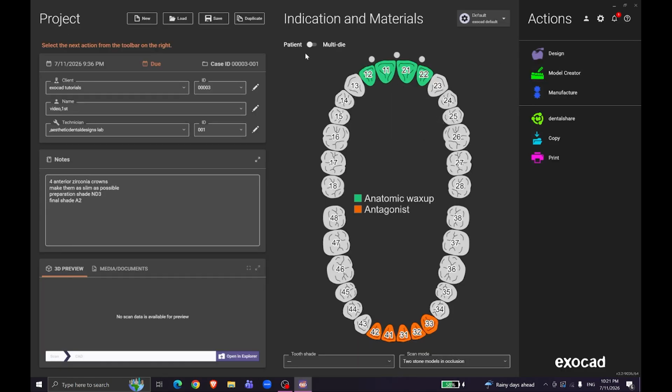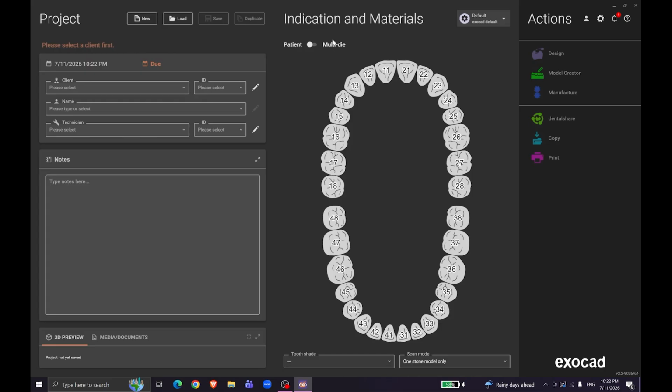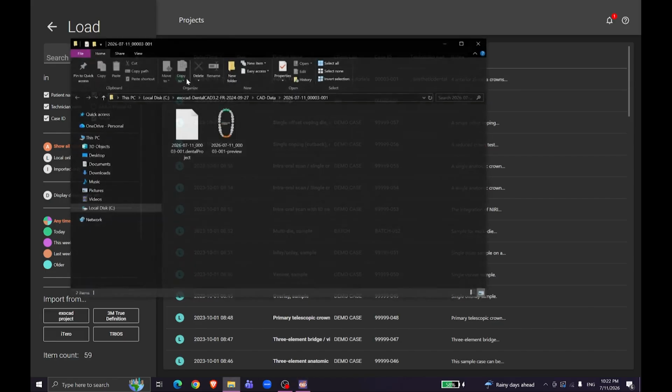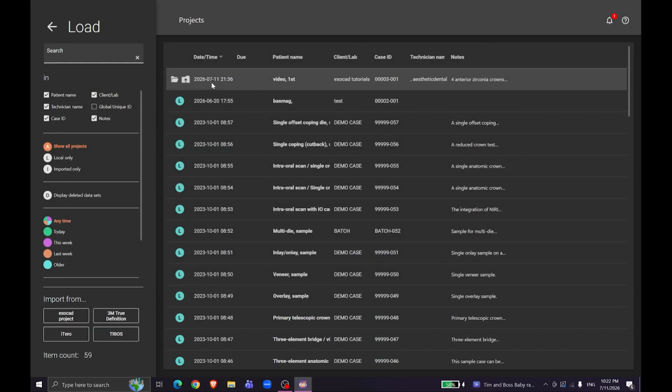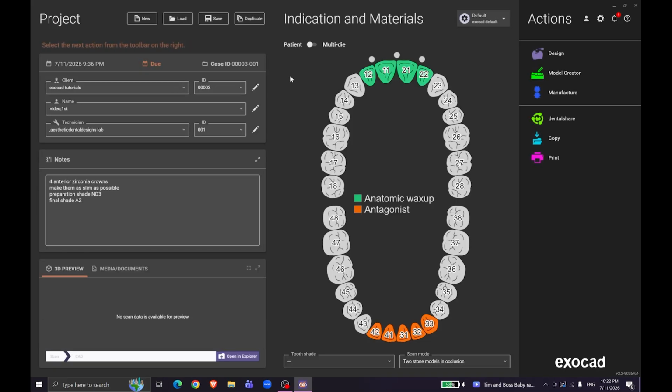Okay, so I guess this is gonna be everything here. You can select this if you have a different type of selection, but usually this one is the most used. Let's go back right here. See, just click on this folder. If you click here, it's gonna bring up the Explorer. You can select your files and copy them, but right now we don't have any files, so I'm just gonna click on that little folder there.